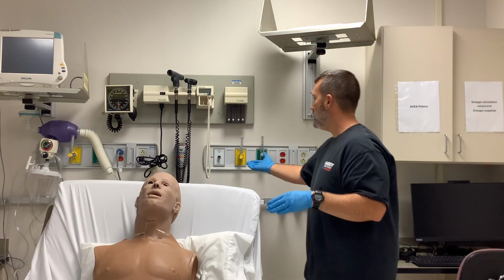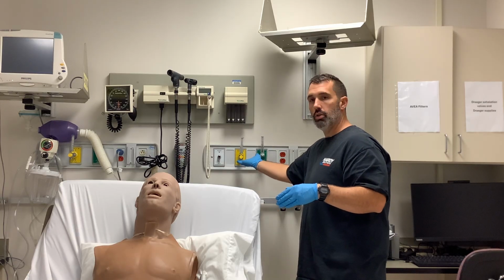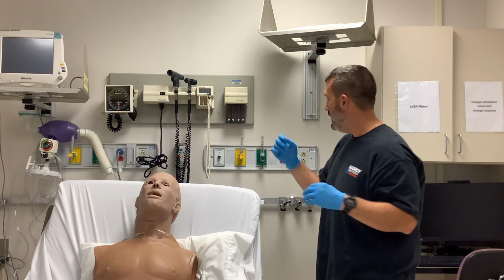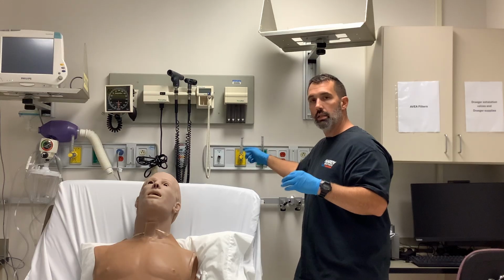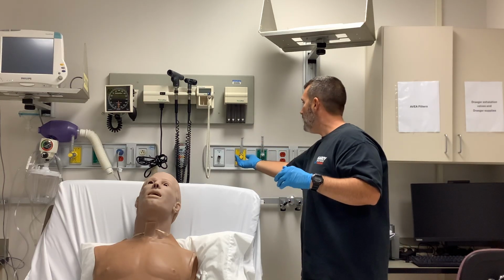So I'd have to take another set of oxygen tubing and attach it to the air flow meter, and because I want to maintain 40% at a 3-to-1 ratio, if the oxygen flow meter is at 1 liter per minute, I have to adjust this to 3 times as much. So it's going to be 3 liters of airflow.